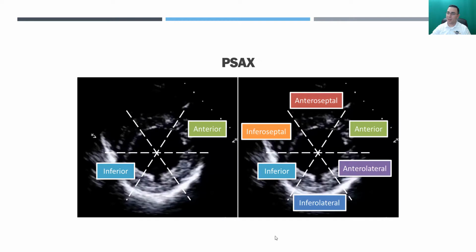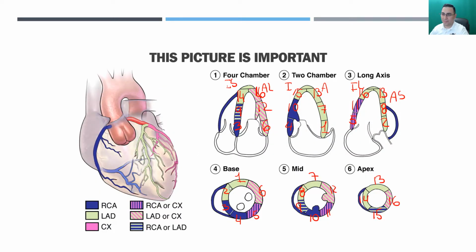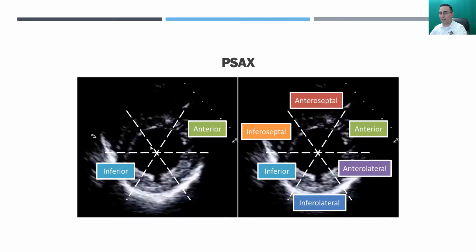All right. So let's take a look at this view for one ultrasound. This is one short axis, and sometimes when you give this picture to students, they think this one is the anterior segment because you study those pictures this way here. Let me tell you something. The heart doesn't have the same position in all patients, so that's good to know. The axis can rotate.